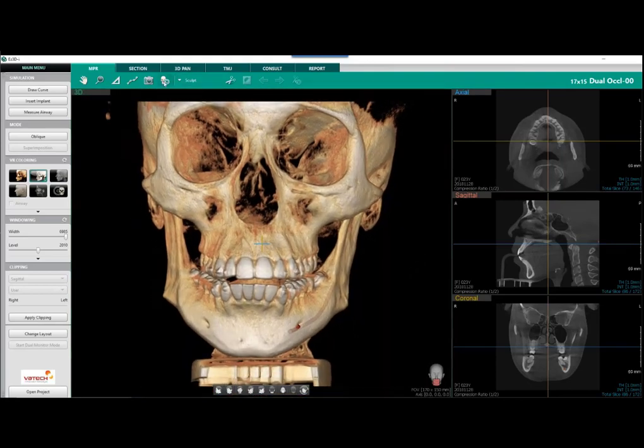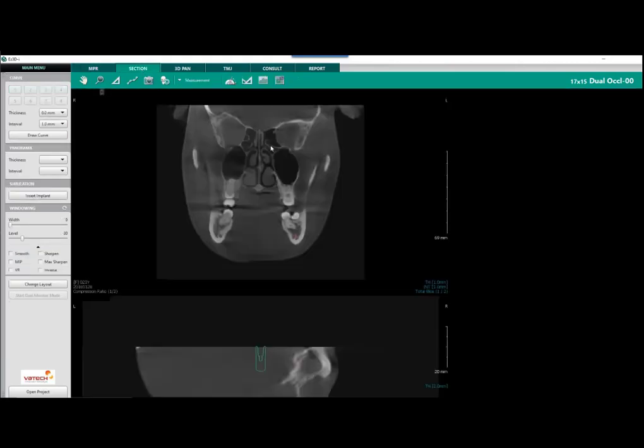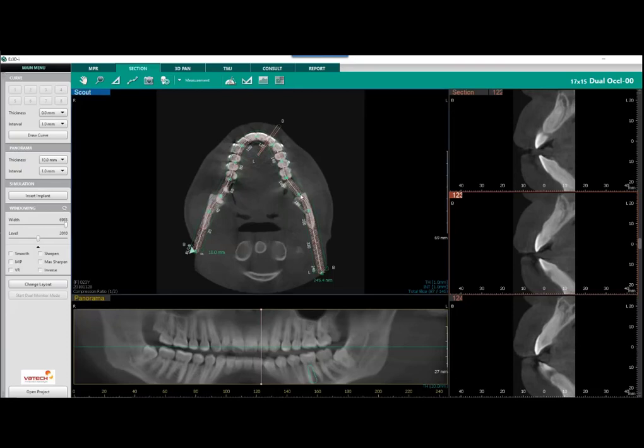Right now, I would like to navigate over to our sectional tab. This is going to be a tool that's going to be in focus next week, but let's go through there and give you some previews. I'll go over to my axial window and scroll down a bit, and I'm going to go over to draw curve. So two different ways to get there. If I click on sectional, it's going to draw an auto curve right here.